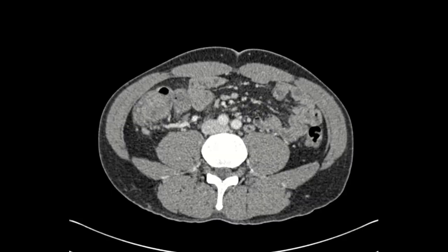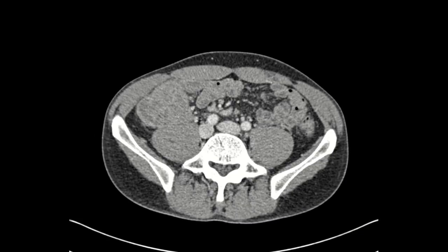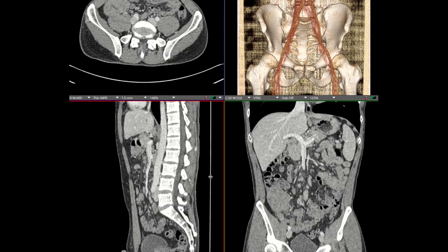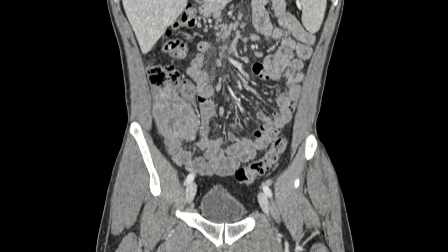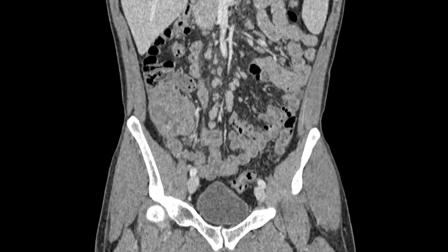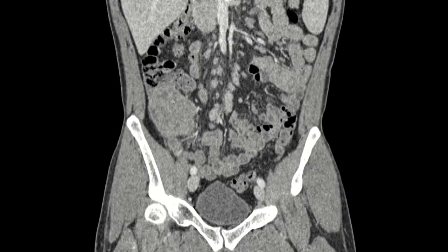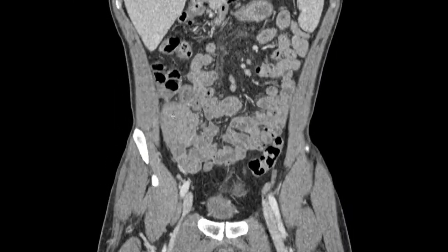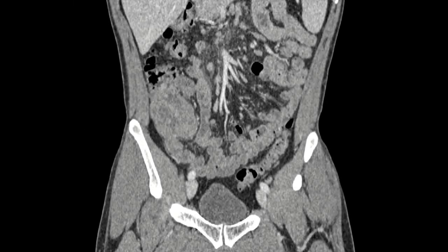You can see it kind of bulge out right here and then just expand the appendix with the soft tissue mass. We can also see this on the coronal image right here. Again, we can see the appendix coming out of the cecum and this mass here with associated lymphadenopathy. This ended up being biopsied and ended up being appendiceal lymphoma, which is a very rare presentation for lymphoma.